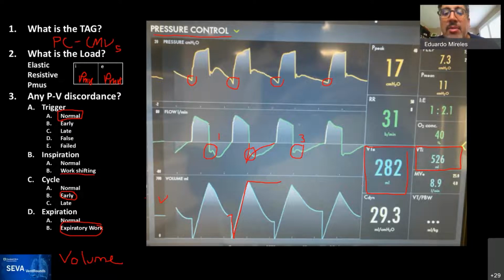But coming back to the tidal volume, I don't think there's a way that you can actually know how much tidal volume you're delivering to the patient and ventilating the lungs. This is one of those circumstances in which using pressure control makes more sense to ventilate these patients, because you're trying to inflate the lung. You will not know exactly where the tidal volume is going to be, and it may be very large if they have a very large fistula, but that doesn't mean that the lung is seeing those 700 or 800 of tidal volume coming out of the patient.